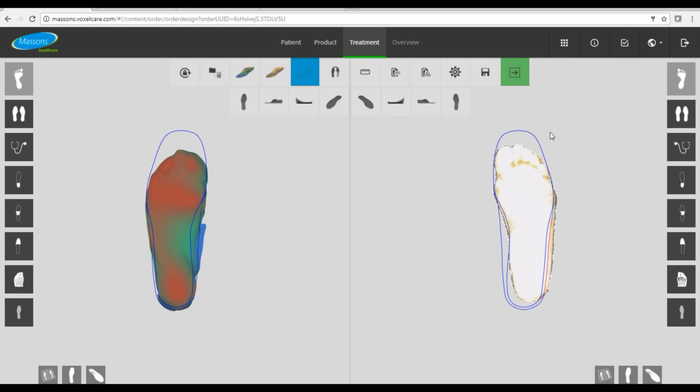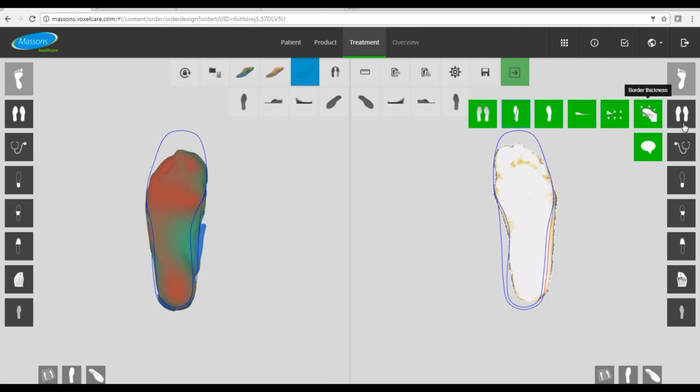All of the data that we filled in the general settings has moved over to the right hand side automatically. The only thing that needs to be done now is the overall alignment, and the pair of orthotics is aligned.